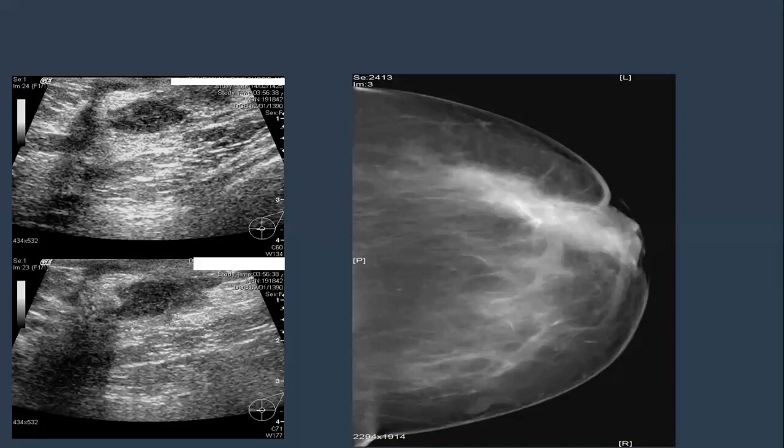Why did you say ductal masses, intraductal masses? Because they are distributed. This is one, this is one, and the direction of this is different. Okay, and not all are directed toward the nipple. Overlapped. Interconnecting. Yes. So what could it be?